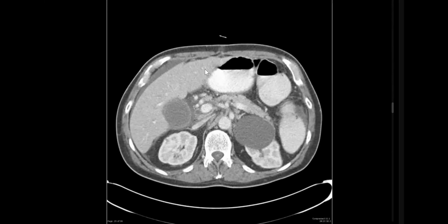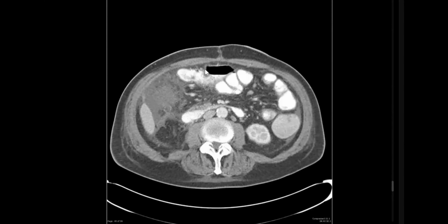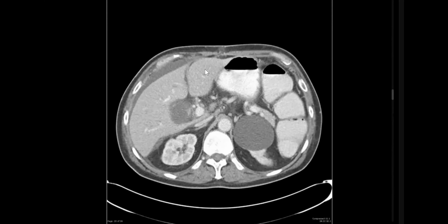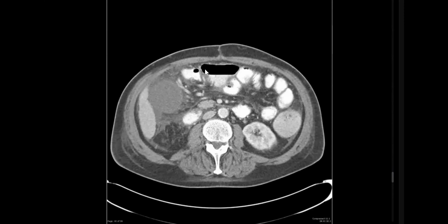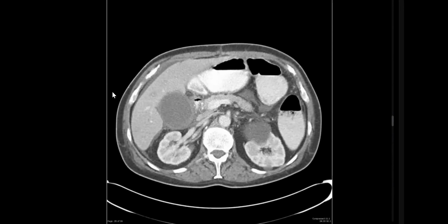So the collection apparently increased, the perihepatic collection increased, the gallbladder is still distended. However, I cannot see enhancement of the wall as in the previous study. This denotes gangrenous cholecystitis, still not collapsed, so maybe with impending perforation, and increase in the fat stranding and the subhepatic and perihepatic collection. So this is an emergency.